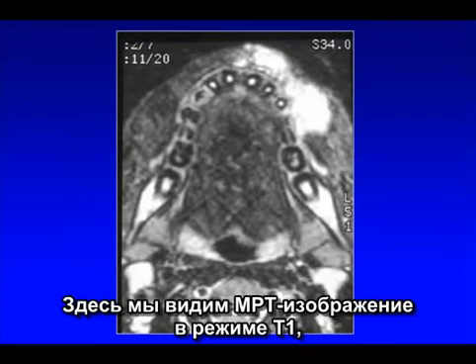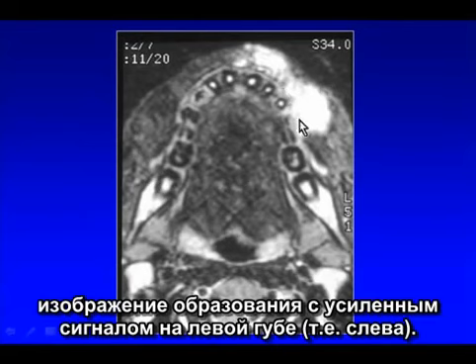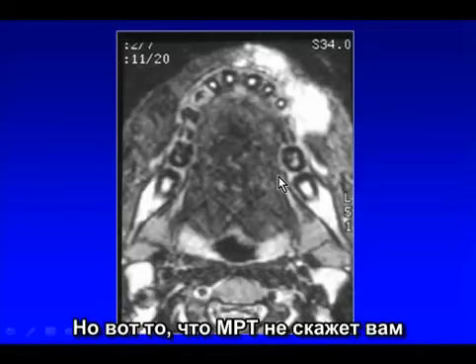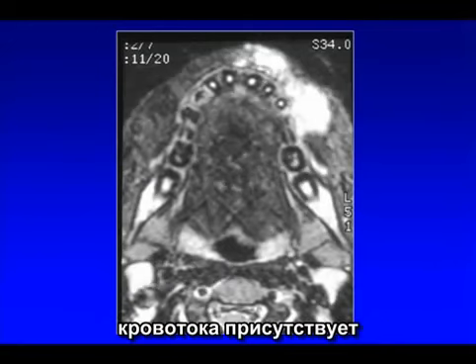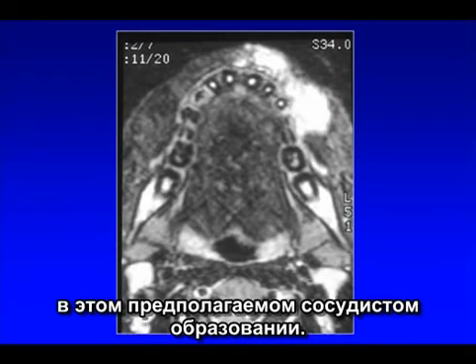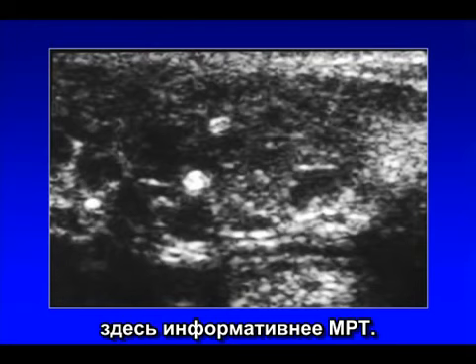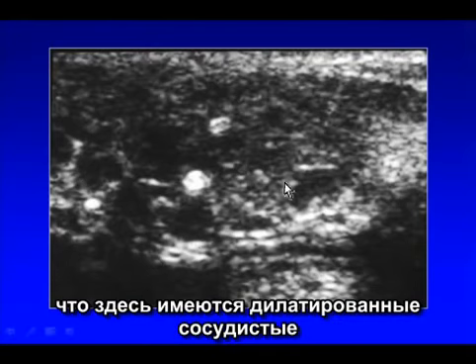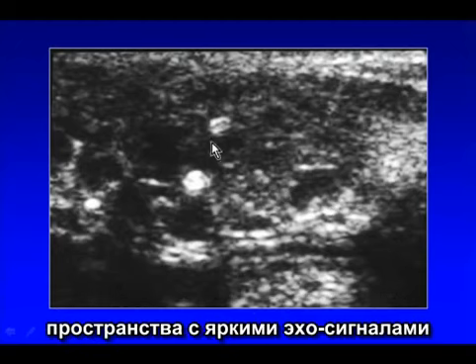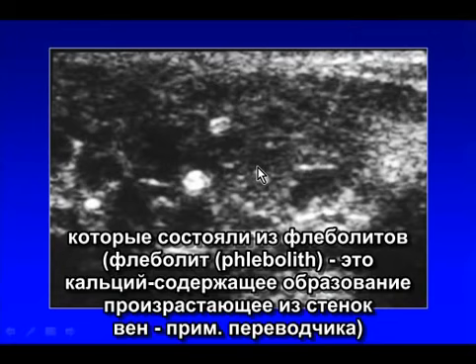Here's an example of an MRI which showed on T1 enhanced images an enhancing mass in the left lip. But what this MRI does not tell you is exactly what type of flow is present within this presumed vascular lesion. And that's where ultrasound is a very nice adjunct to MRI. When we did an ultrasound of this lesion, we found that there were dilated vascular spaces with bright echoes interspersed, which were consistent with phleboliths.